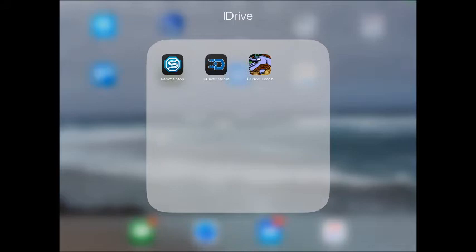This is an iPad Pro that I'm using, so I'm not sure what the perspective or ratio of the screen will be, but we will try it here. First thing we do is click on the app, and we see connect, log in, and about. You will not be able to connect to a unit until you log in. Right now I am logged in.